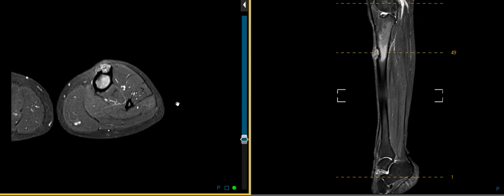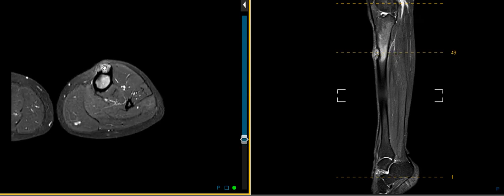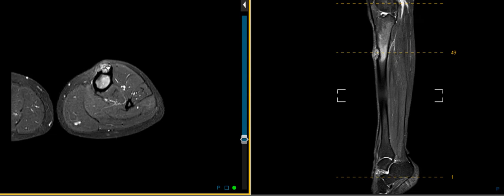This is a STIR image, and on this view we see the lesion right here. We see it has some speckled areas of low signal on a background of bright signal. This is what we call a chondroid matrix. You can see the differences, like areas of low and bright signal. We think that it may have chondroid material within it, so we call this a chondroid matrix. Again, it has sharply defined margins, and the cortex is scalloped. You can see it looks like it arises from the cortex or the periosteum.